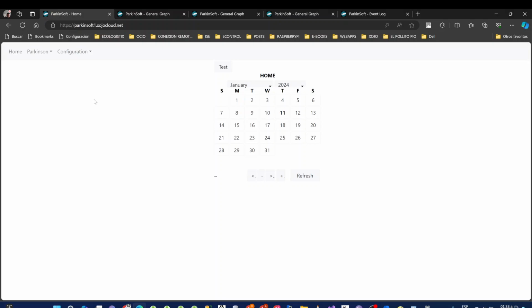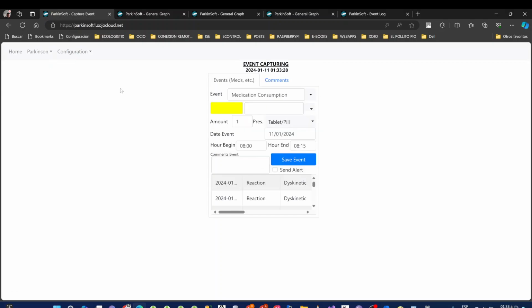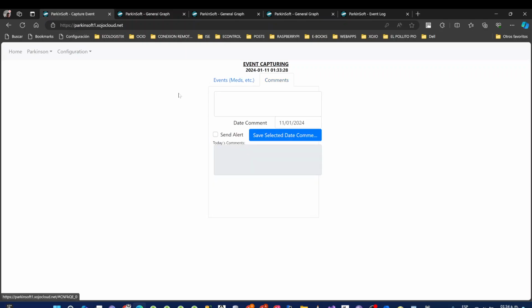There might occur events that break the automatic uploading of information. If this occurs, the user has up to 7 days to recover and upload tremor and dyskinesia data. Consultations, or visits to the doctor, studies, and interventions, can be captured manually. Therefore, either the patient, or the app manager, can capture them in the parkinSoft web app.